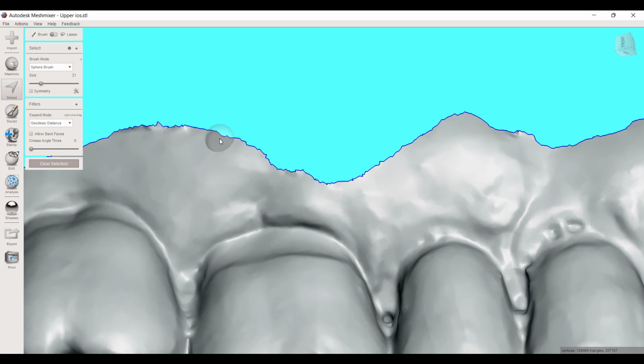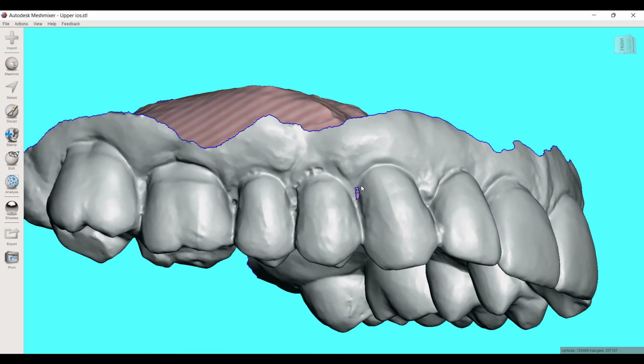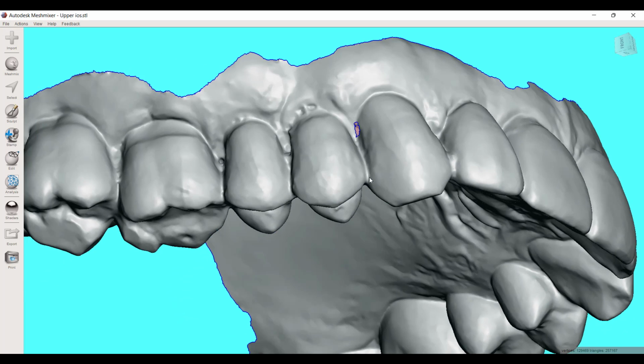Sometimes when you have an intraoral scan, you'll get little jagged borders or areas of overlapping mesh. And if you've got that, you might want to focus on that more during your scan and ensure that you're not including that as part of your scan. That's the easiest solution. Or if you only notice it after the fact, I would just say cut that out.